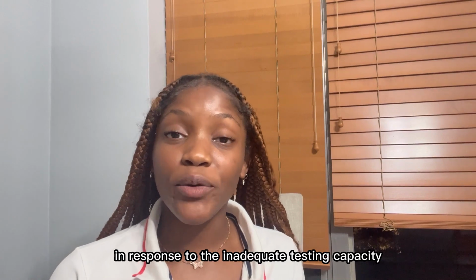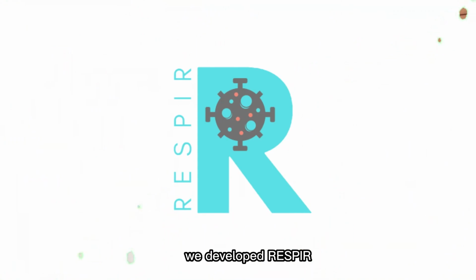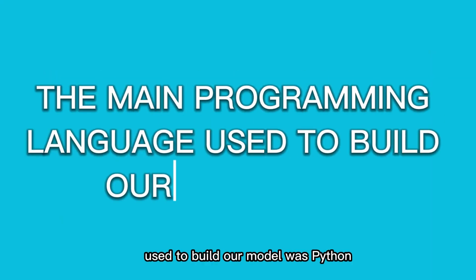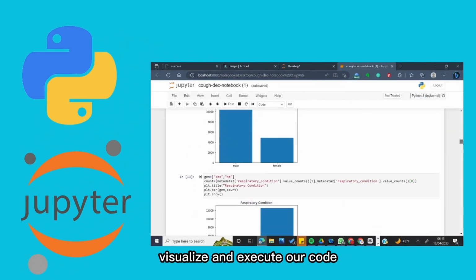In response to the inadequate testing capacity in many developing countries like Nigeria, we developed RESPIR, a fast and efficient AI model which uses machine learning techniques to screen for COVID-19 using cough sounds. The main programming language used to build our model was Python. We also made use of Jupyter Notebook to write, visualize, and execute our code.